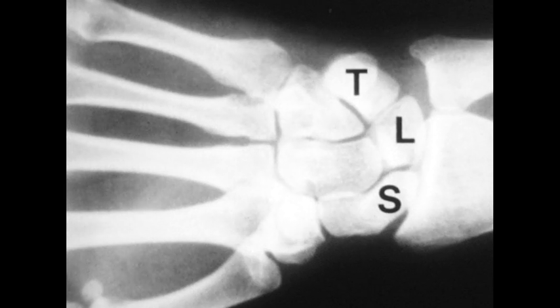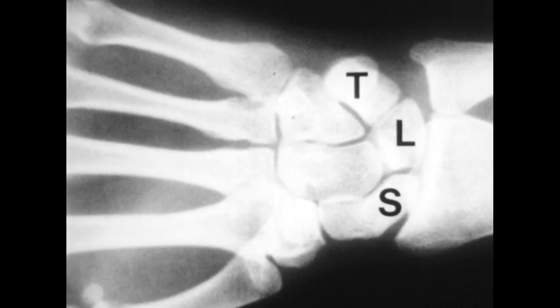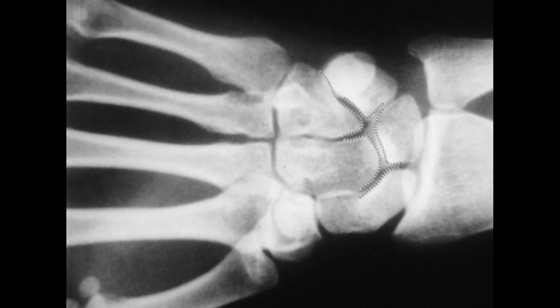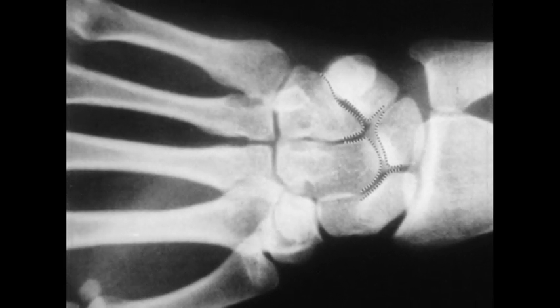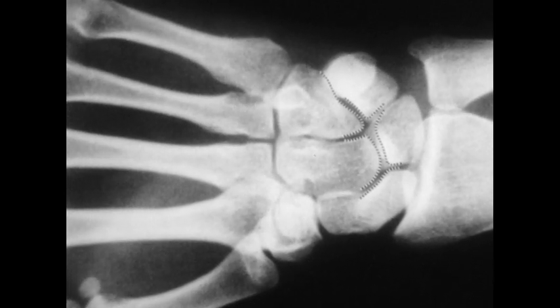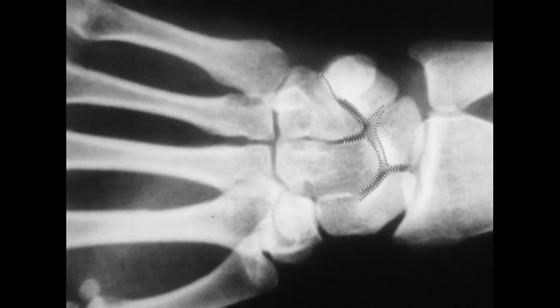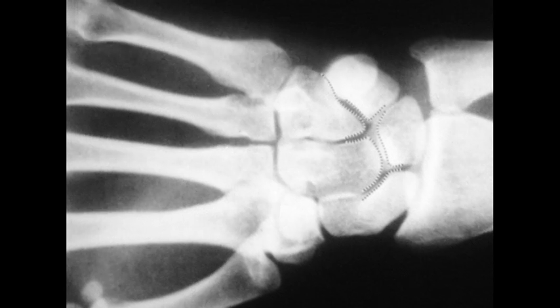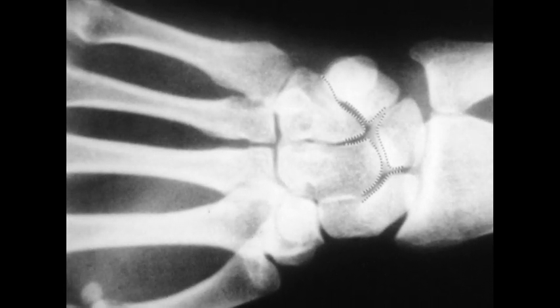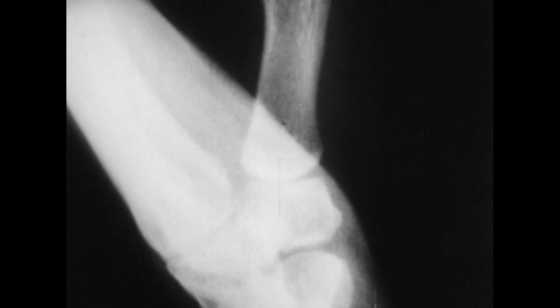The joint between the scaphoid, lunate, triquetrum, and the distal row of carpal bones is the midcarpal joint. It is bound by palmar, dorsal, radial collateral, and ulnar collateral ligaments. The intercarpal articulations are surrounded by a capsule with an extensive and irregular synovial membrane extending to the carpometacarpal joints. The carpometacarpal joint of the thumb is a saddle joint combining mixed gliding, rolling, and rotary movements.